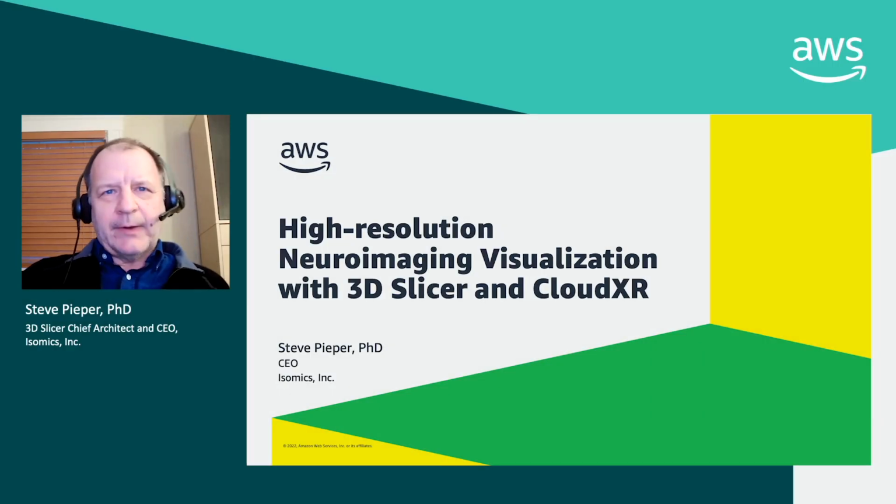Hi, I'm Steve Pieper, and I'm here to talk to you about high-resolution neuroimage visualization along with 3D Slicer and CloudXR. These are some really interesting technologies, and we're going to give them a shot and see how they work well in practice.